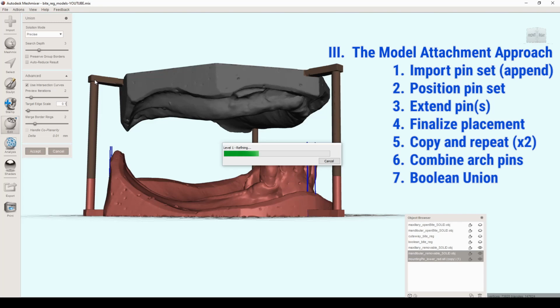It's weird though, because these errors, it doesn't even look like it's near where the things are actually unioning together. All right, I'm going to pause this, and whether this finishes and it works or whatever I do to fix it, I'll let you know, and I will be right back.